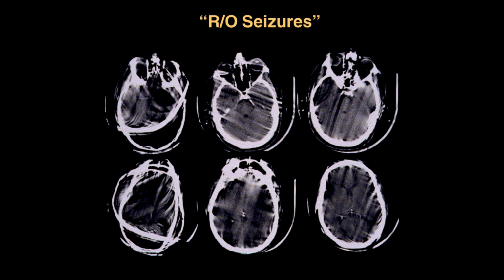Now, this was another patient. I didn't save the requisition, but it really said rule out seizures. Here's a functional CT exam. They had a seizure on the scanner, and this was one of those rare instances where I said, yes, this is seizures because I saw them, but I don't think that particularly helped them. So functional CT, not widely practiced.